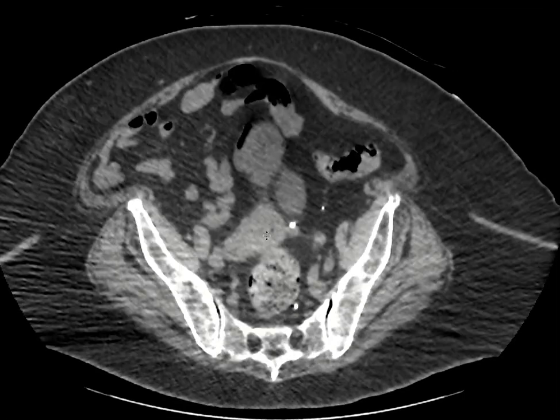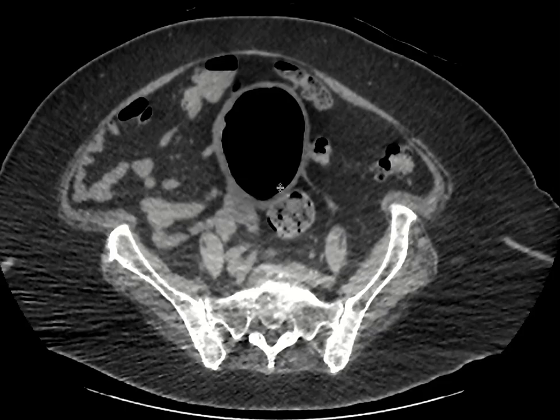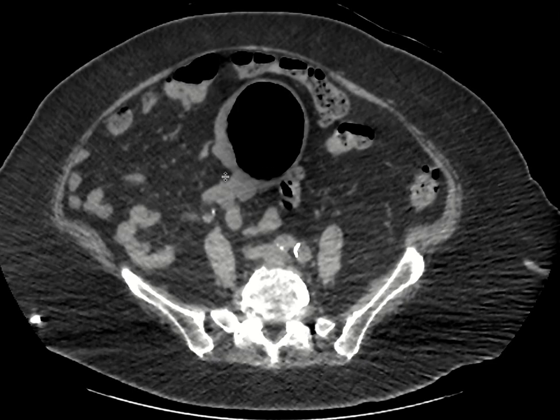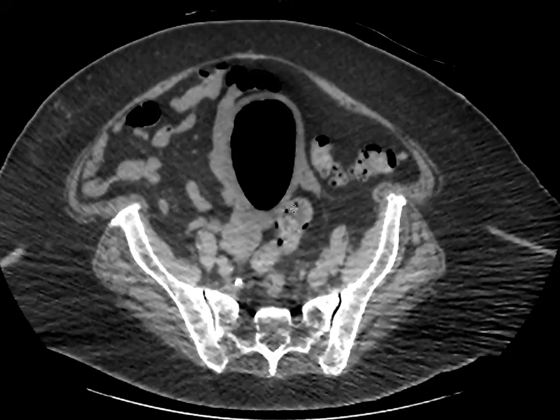And so it's important when evaluating air within the uterus to look at the bowel loops and see if there's inflammatory changes that may have caused a fistulization with the uterus. And in this case, everything looks fairly clean around the uterus, and there's no real abnormality in the bowel that's adjacent to the uterus itself.